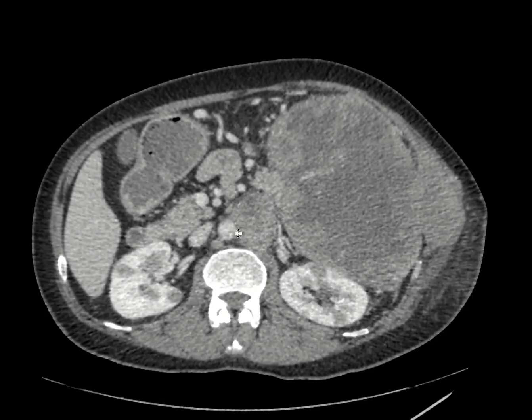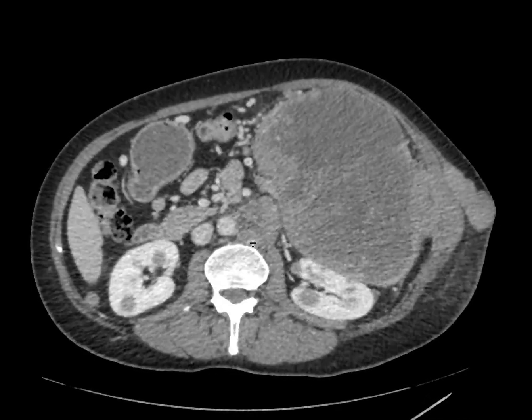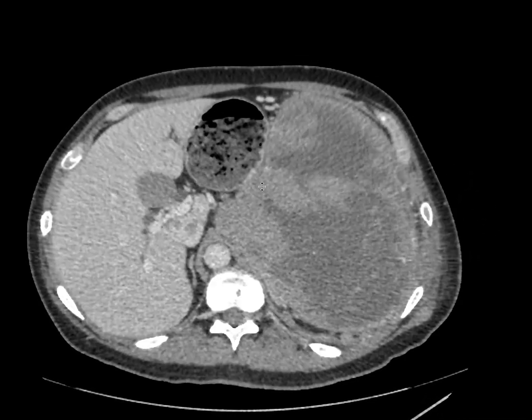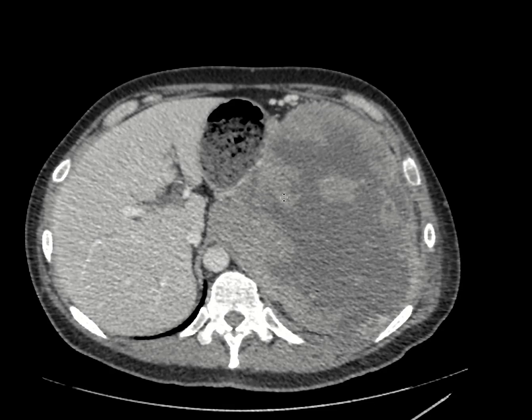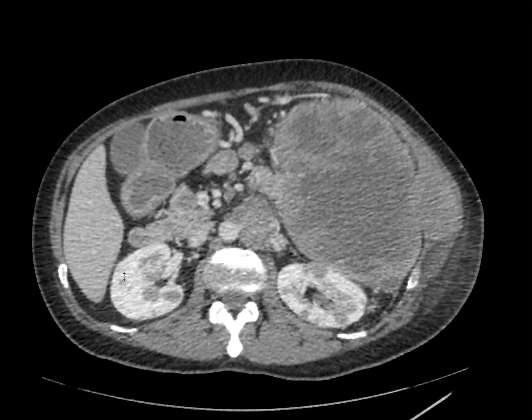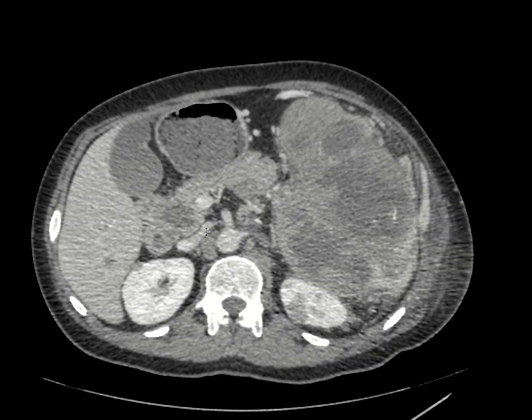There's also a retroperitoneal lymph node here, a left periaortic, enlarged lymph node with central necrosis. This ended up being a patient with lymphoma, so these are all lymphomatous masses involving the spleen, involving the kidneys, the retroperitoneum, and interestingly also the pancreas.